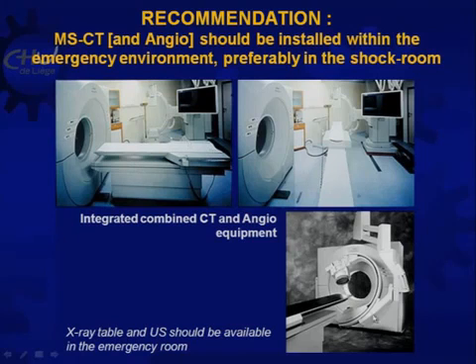You can switch from the CT to angiography, and you can also switch from angiography to CT. And I will give you examples. This, of course, is a little bit elaborate, sophisticated, I agree, but it is really of great importance in management of the trauma patients.